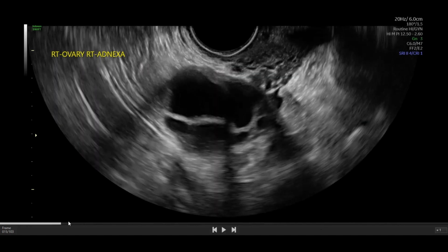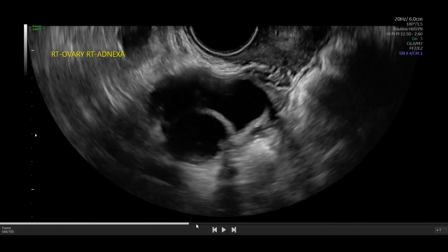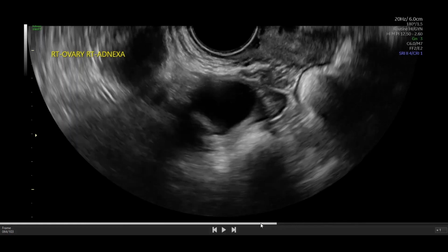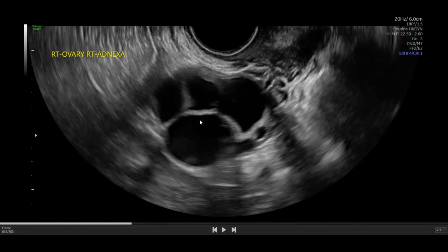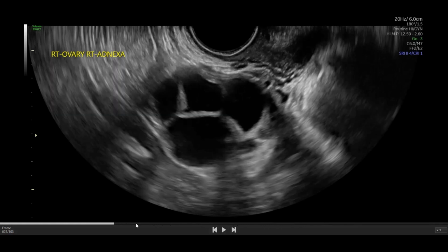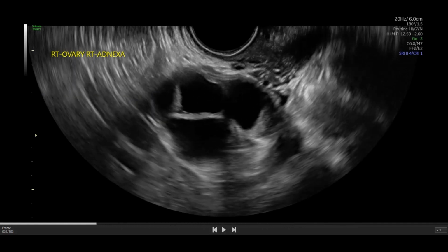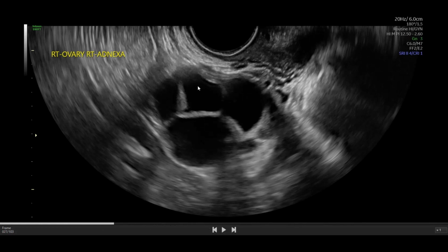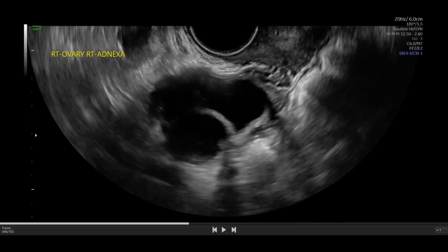So as we scan through this, we are looking at, do these cystic components connect to each other or not? Is this a unilocular or a multilocular cystic lesion? And you can see, for example, in this section right here, these two areas do connect as that cine loop is progressing through. So we might be able to describe this as a single locule, but I don't see a connection between this and this, for example, or this and this. So we definitely have 1, 2, 3, 4, at least 4 locules so far.